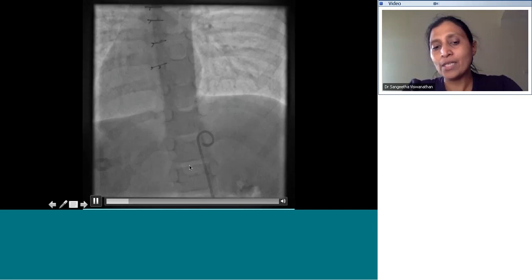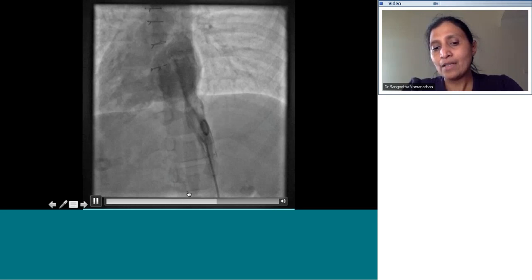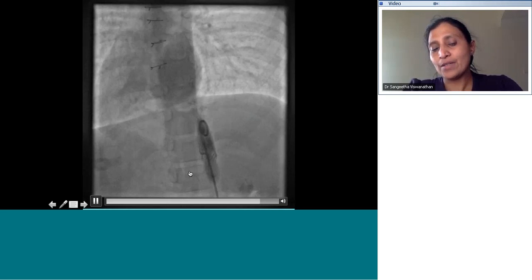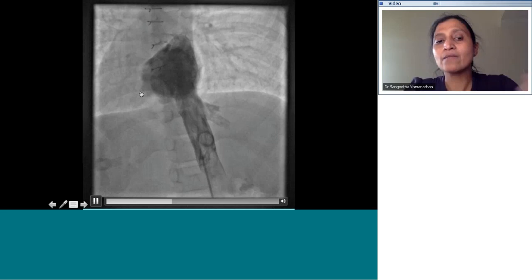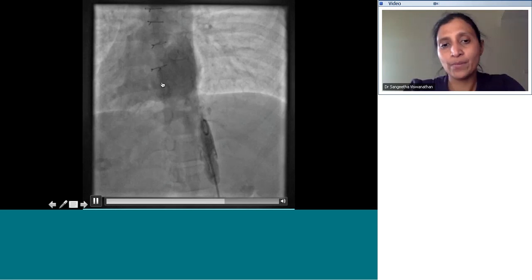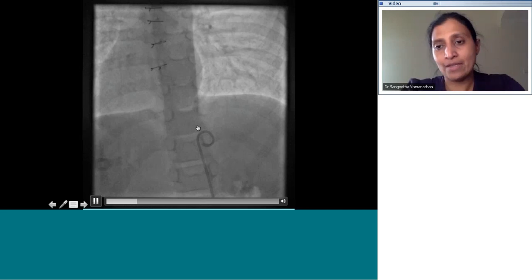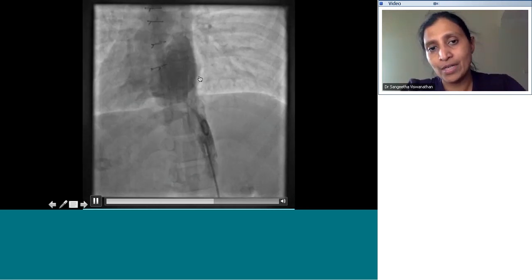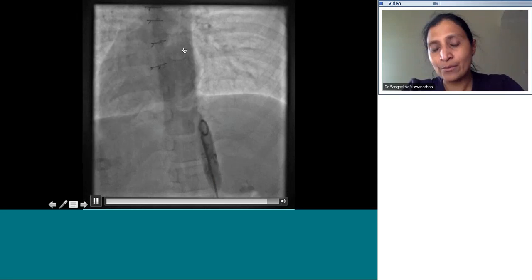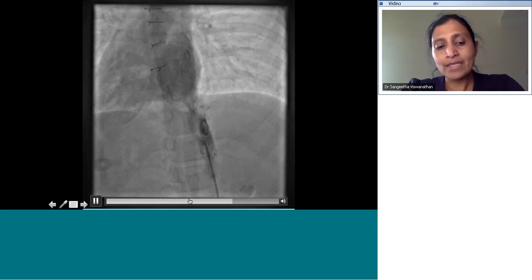So you can see that the aorta fills here. So the aorta is to the right and the IVC is to the left. So this is situs inversus dextrocardia in a post-operative patient, and the IVC is opening into the atrial mass. This is not a Fontan circuit like somebody had mentioned earlier. And this is the right atrium. You can see the right atrial appendage here, right at the top. So this is situs inversus dextrocardia.